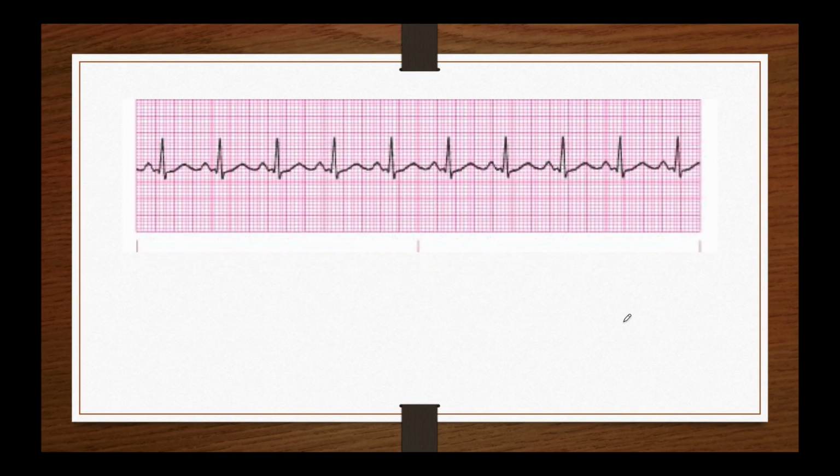Now, we also have what we call the 6-second rule. When we say this, what we mean is anytime you pick up the ECG paper, it is marked by the first second. So you see a mark over here as the first second. Then we have also the 3rd second. Then we also have the 6-second marking over here.